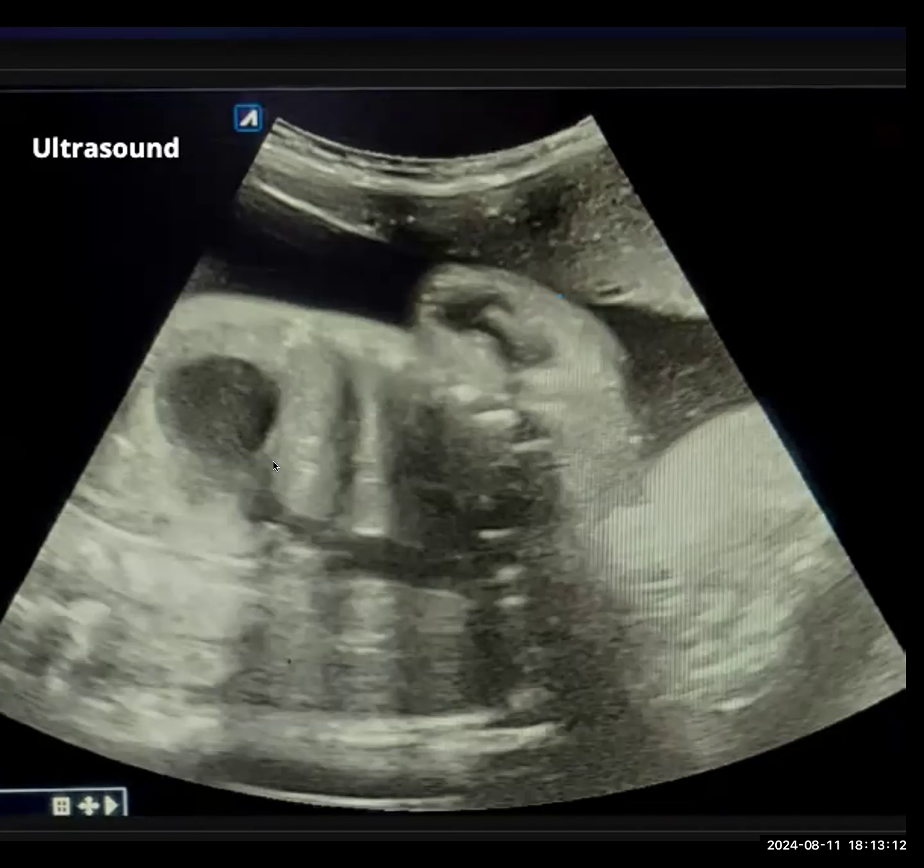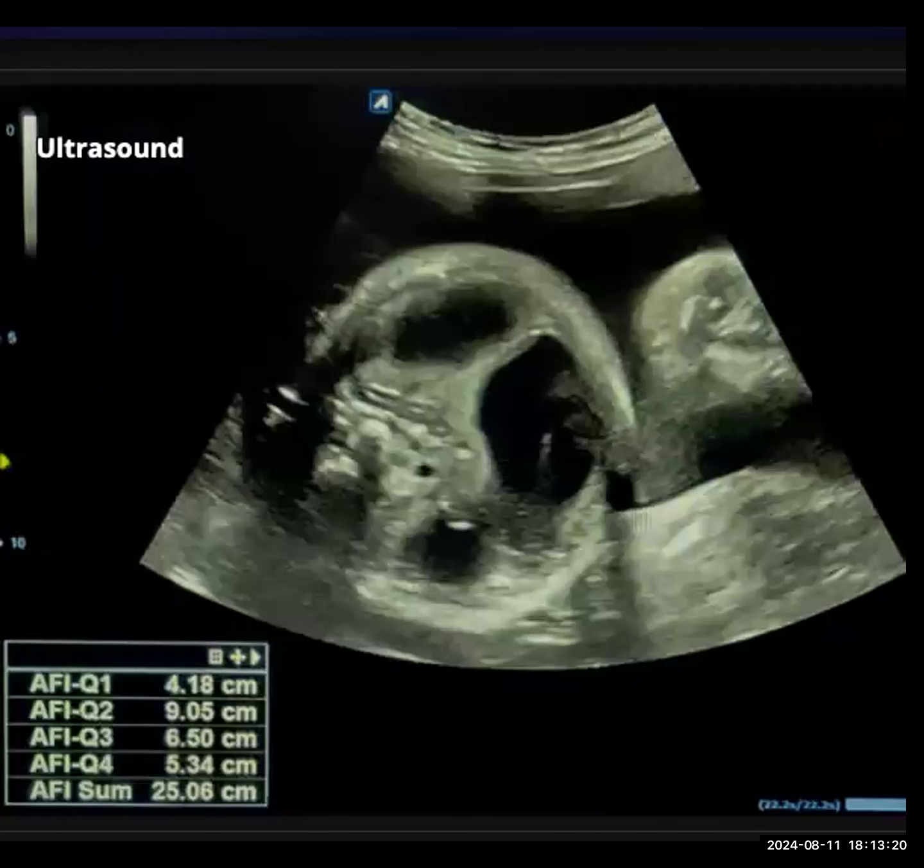What would you like to do next? I would like to see the dynamic set of images in my routine practice and correlate on the other views. Unfortunately, we have only one more image, so this is the image.